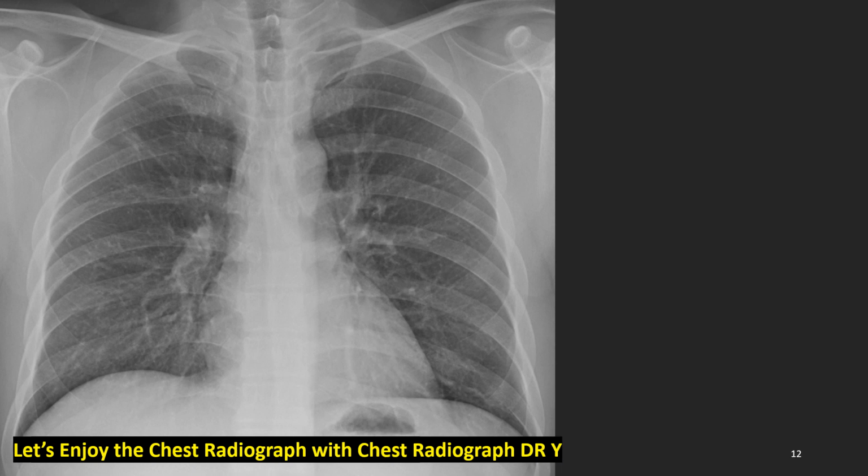What do we see in this film? You got it? Okay. Right upper lobe. Sure, that's right upper lobe. This is the minor fissure, so that's right upper lobe. This one, about 1.5 cm, somewhat increased opacity. Yes. Let's look deep into the lesion pathology.